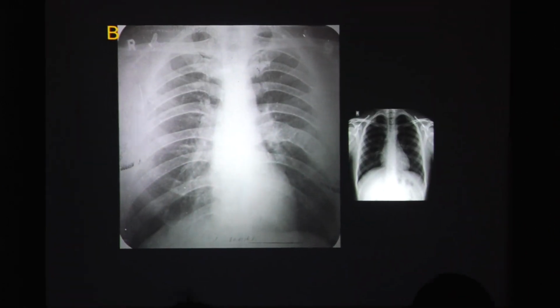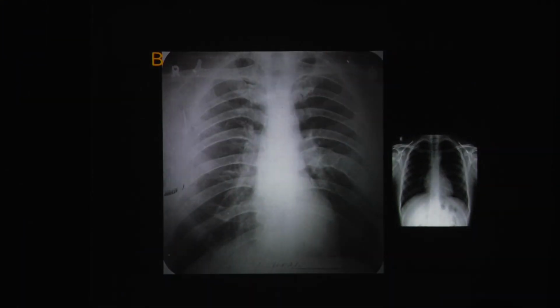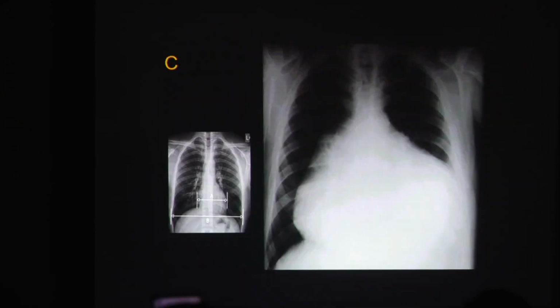the supine patient. Now after A, we have come to B, that is assessment of bone. You have to look at all the bones. Here you can see a widened rib on the left side.